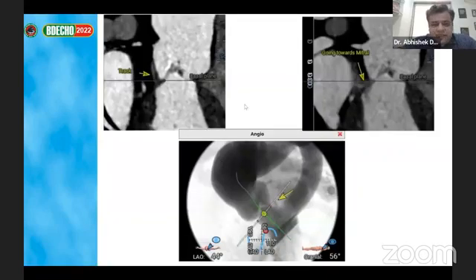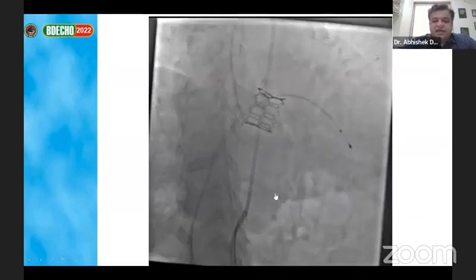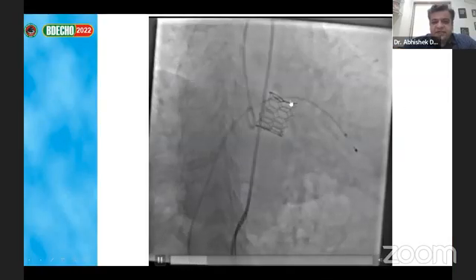We checked on a CT. It was actually because of this aortomitral tunnel, as you can understand from these views, that this is where the attachment of the mitral is. This is where it starts from the left cusp here, as you can appreciate the tunnel happening. So this case was not because of the PVL. We changed the view, we changed the angle, and we could demonstrate the tunnel separately. As you can see, there is a tunnel here.